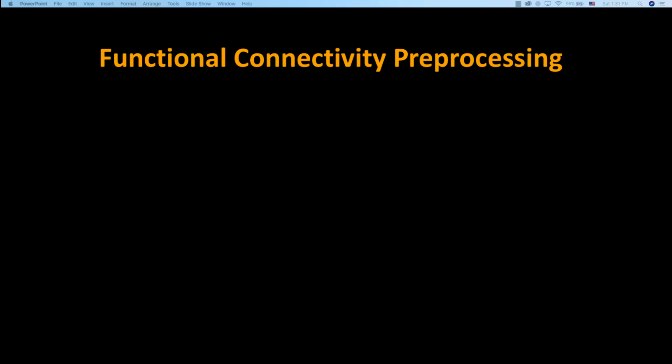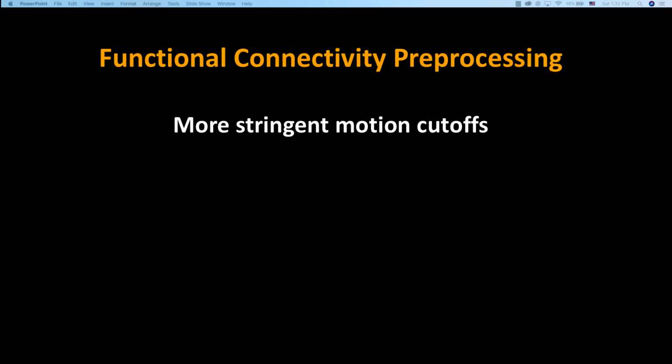Now, functional connectivity preprocessing. What we have just done, the reason that I wanted everybody to download and run that sample SPM script, one is to test whether your SPM works, because the CONN toolbox will use SPM commands for everything. But it also did a bunch of pre-processing steps, which we're going to revisit in a little bit.